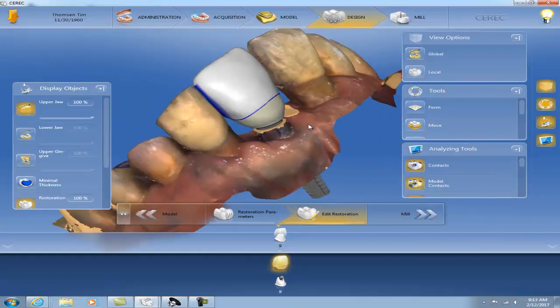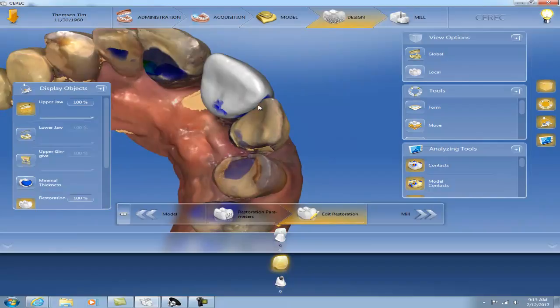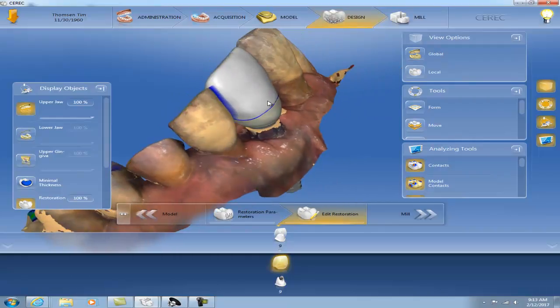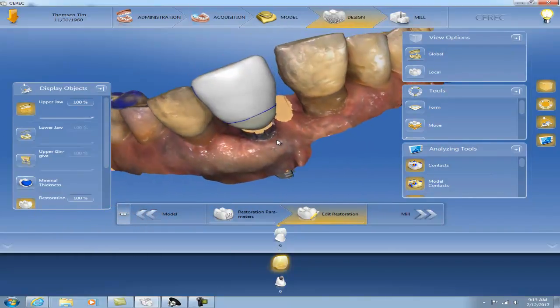So what you can do is design this case in LT e.max, with the same veneering restoration on top, and make this area like a laminate, keeping just the contact area on the abutment. When it's done and the access hole is placed, you place the abutment, then eventually cement the restoration on top of the abutment. It's much easier and will give you a much more aesthetic result.